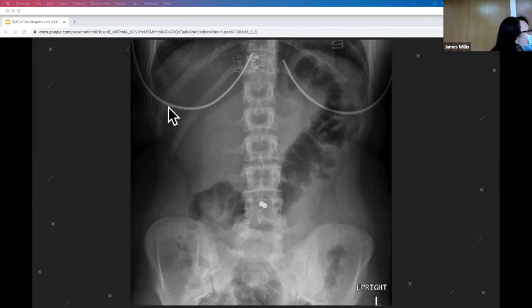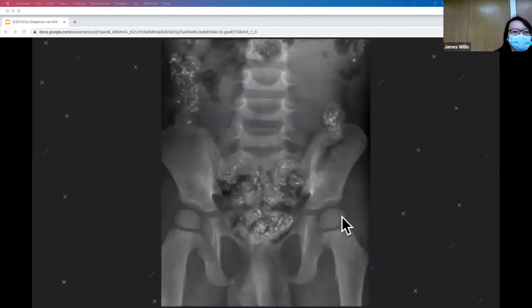So these are the broad wire, sure. What's this right here? Foreign body. Yeah, it's a foreign body. In the past, I think these are banned in the United States now, but they're called buckyballs. They're just two magnets that kids play with. If they ingest them one at a time, they end up in different parts of the intestine. So these magnets are not next to each other. They're next to two parts of probably some sort of small bowel. It can cause necrosis of the bowel.